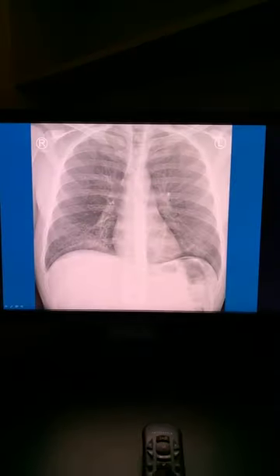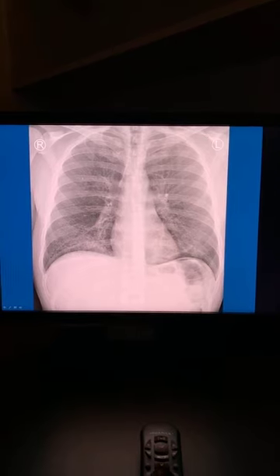Case number 7. What do you guys got? Go for it. Tell me.